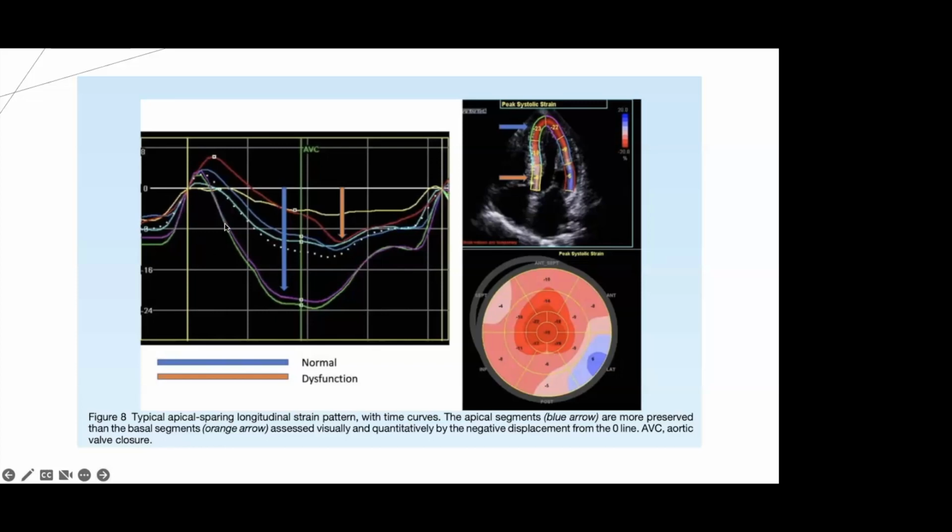As the myocardium is contracting, it's being graphed onto the plot on the left-hand side. And the more movement there is, the more it's approaching that -20% area here. And the less movement, like near the base of the heart here, is close to 0 or the low negative values.